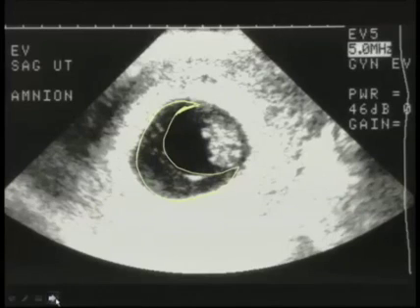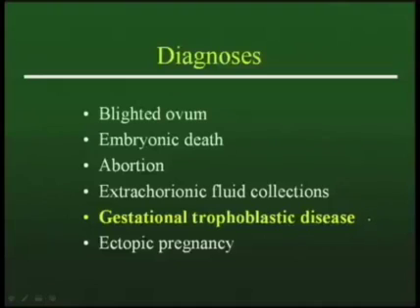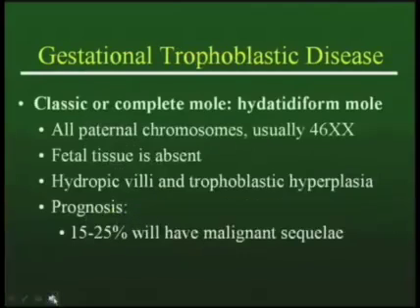Then the issue of gestational trophoblastic disease. The most common form that you will see is the so-called classic or complete mole, or hydatidiform mole.